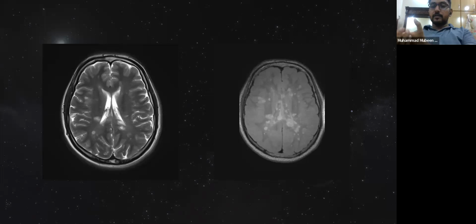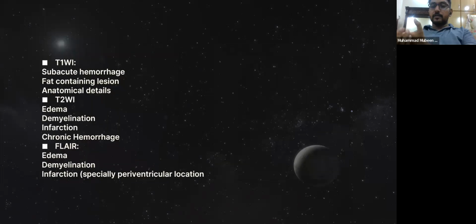So what we look at on T1, T2, and FLAIR images, I have already basically told you, but to summarize again, you can take a screenshot of this image. What should we look at on T1? T2. Sorry, can you hear me?